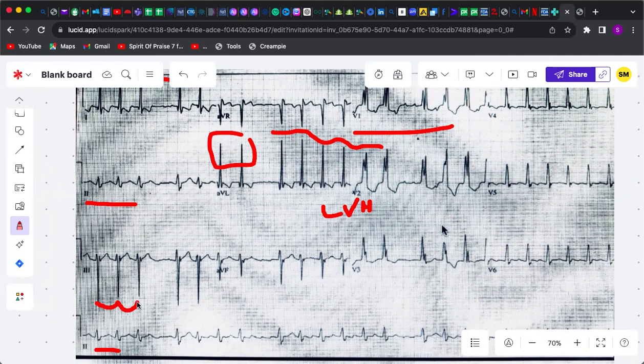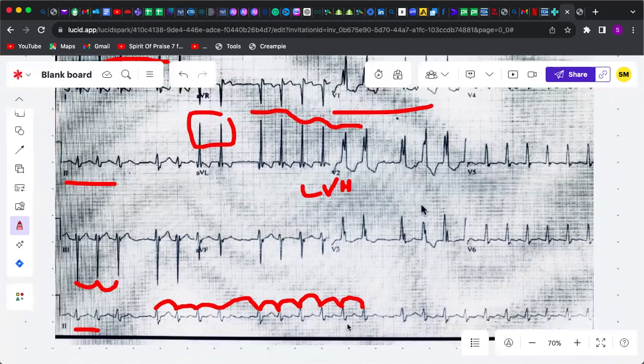And then when we look at the RR intervals, are they equal? Yes. But it gets to a point where it looks a bit unequal. I mean, irregular, yeah? So when we map the R to R intervals in this area, actually they are regular, okay? But when you move on, it becomes irregular, right? So this is the situation that we have.